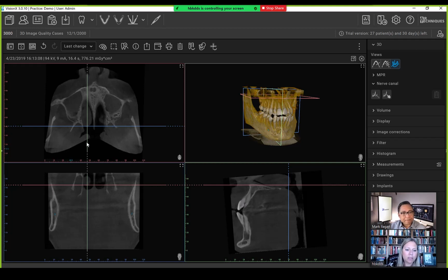So with that, you're not going to see the cervical spine. So usually that's one of my passes that I'll do. I probably still am going to do 3 passes. I typically try to keep everything exactly the same. I'm very systematic in how I review it, so I make sure that we don't miss anything. I don't take any shortcuts as far as that goes, even when we have the smaller volumes.